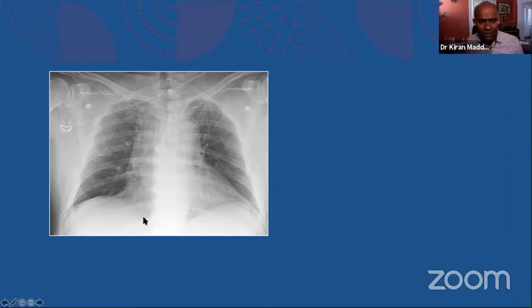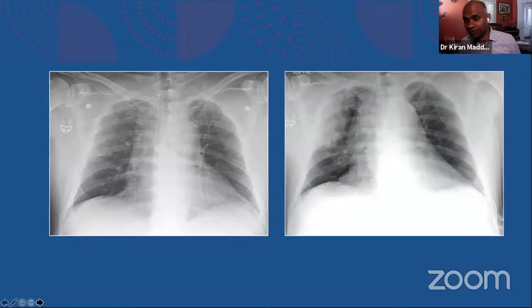So moving on. This is a chest radiograph in a blunt trauma patient. The initial chest radiograph, my reading was negative, normal chest radiograph, no trauma-related findings. I would have been more careful, but that's what I could do in a busy setting. Retrospectively, I see something there, but after 6 hours, the patient was not doing comfortably. After 6 hours, they repeated a chest radiograph. So what do you think the diagnosis is?